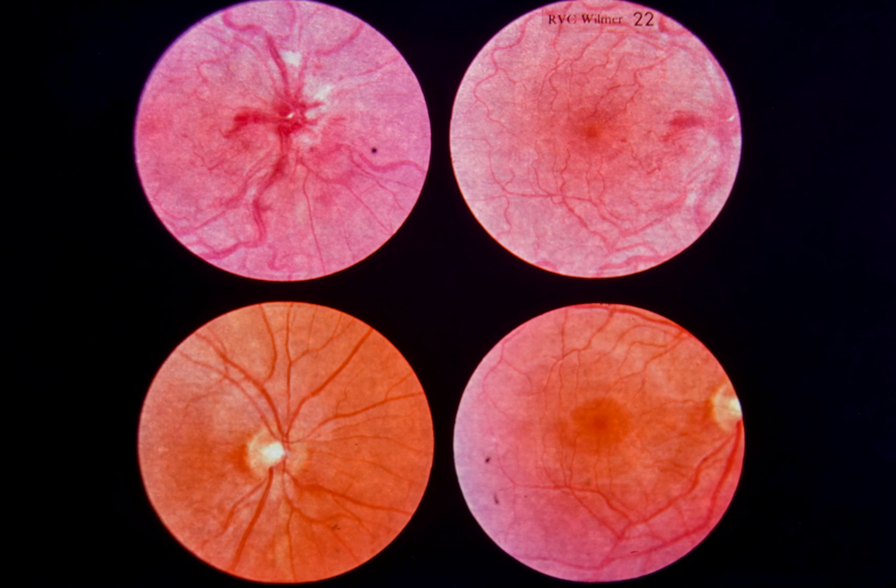This patient represents a variant of central retinal vein occlusion known as papillophlebitis. The etiology may be a mild inflammation involving the central retinal vein or its tributaries, or both. Patients with papillophlebitis are invariably young and healthy and have no evidence of systemic disease such as hypertension or diabetes mellitus. Although steroids have been used to treat papillophlebitis, their efficacy has not been proven. The etiology of this condition remains unclear, but visual and ophthalmoscopic recovery is the rule.